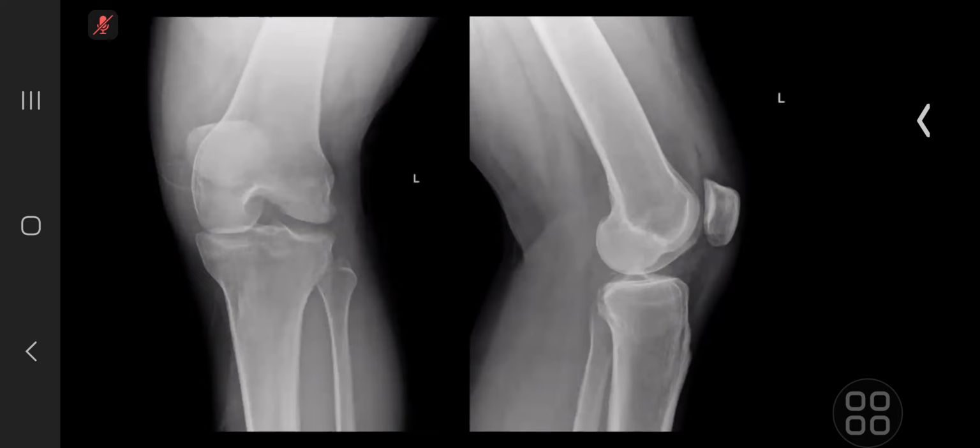They may wish to proceed to cross-sectional imaging to confirm the findings on the tibial plateau. And I'd also want to check with any previous imaging that the patient has had to see whether the appearance of the femoral condyles is the same on that imaging, or this is a new finding.